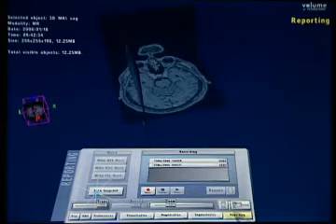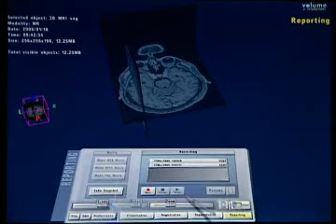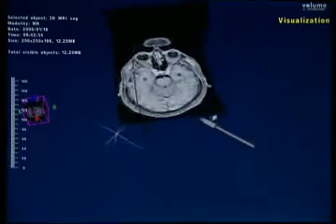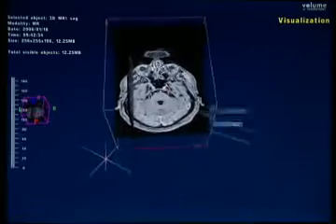And of course you can report, you can make snapshots and print snapshots which you can take to the operating room of the different steps of the planning procedure. You can print them also in red-green stereo, so if you want a stereo snapshot in the operating room, we're doing that all the time in Mainz. You can generate them during your planning session and then hang them onto your wall in the operating room. And you can make movies, of course. You can record everything you do and play it back and turn it into some different formats of videos.